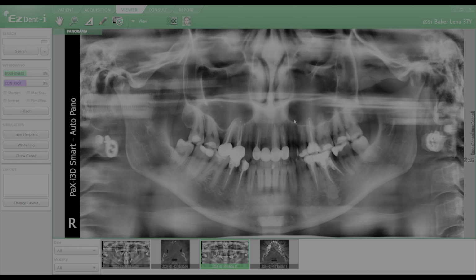And then also making sure that we place those implants where they need to be and avoiding cantilevers when she has very large sinuses, right? Again, the sinuses are just air-filled cavities. So this case is actually a pretty complicated one. These are very large sinuses, and you can see the delineation of where they are. Again, just big air-filled cavities.